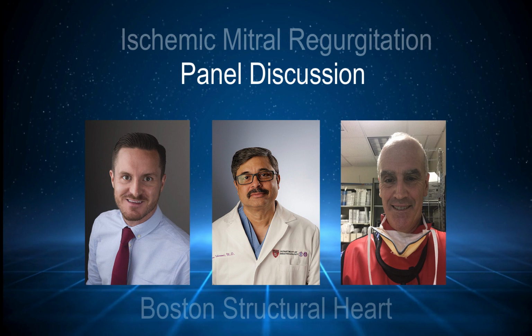What you find is sometimes right at the valve, for whatever reason, maybe there's dropout, and there's almost no color. And then you say, well, should I raise my plane up a little bit? Now you're getting into a jet, especially the central jets that start to expand. So where do you actually make your measurement? Is there color Doppler bleeding?